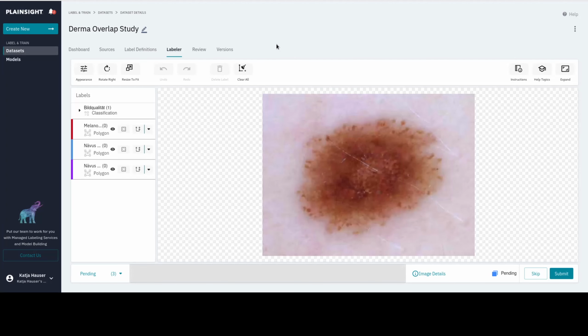Now we get to the annotations. What we need from you for each image is an annotation of the image areas relevant to the diagnosis, together with textual explanations that you select from an ontology. I'll demonstrate this with a very simple case first, and then show you two more complicated cases.